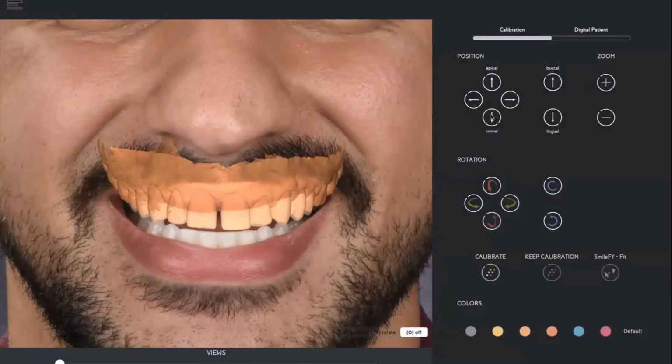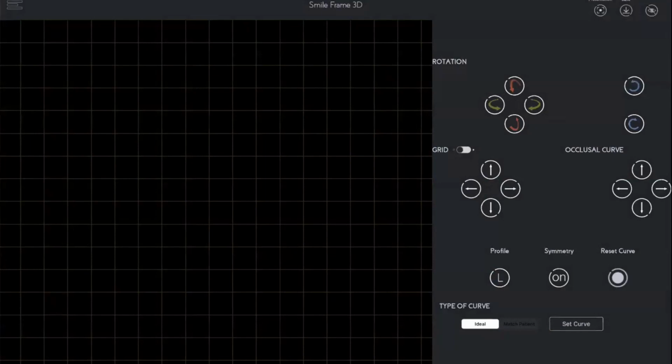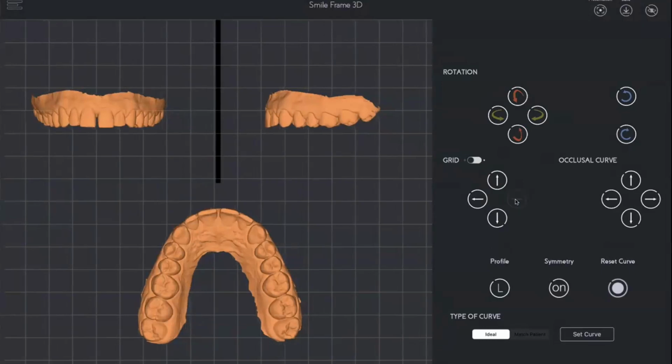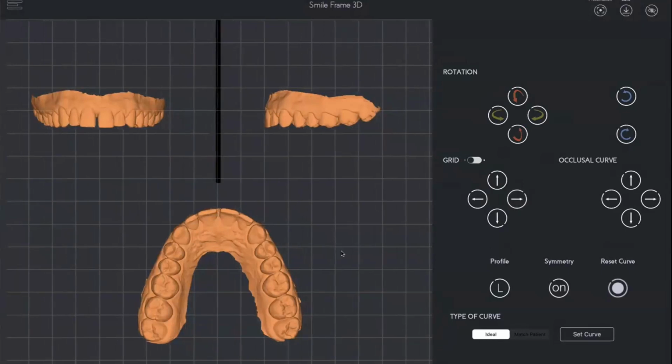It's the 3D Smile design. This step can be done manually. That's totally fine. And now what happens here is very, very fast and very, very fascinating, I think. In the first step, we calculate automatically the occlusal plane from the intraoral scan. As you can see, the occlusal plane, the profile, and the occlusal view are set automatically and accurately. If you have the palatal area, then we see the midline of the scan, and you can see the midline is pretty accurate.